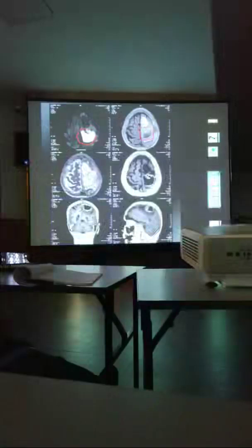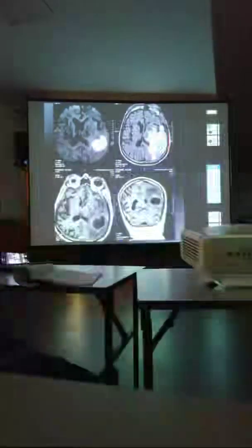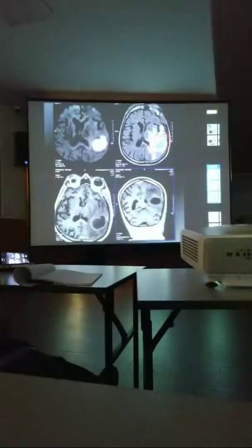It is light bulb diffusion restriction and attenuated central bright signal, marginal low signal rim, and a FLAIR or SWI dual rim sign, which is a continuous dual rim sign, and a marginal enhancement. Unless otherwise proved it is pyogenic. This is the full manifestation. You can see the dual rim sign. The word is very important: the continuous dual rim sign in FLAIR or SWI. And it is light bulb diffusion restriction, marginal enhancement. It is the typical appearance of pyogenic abscess.